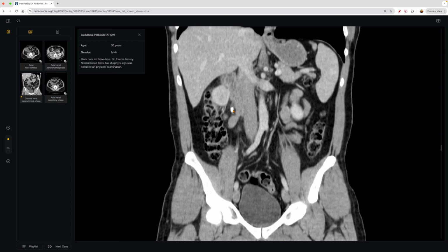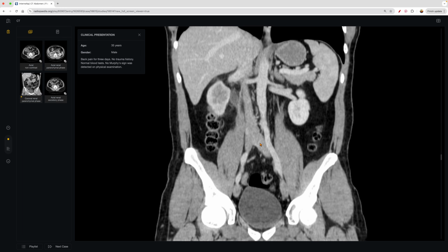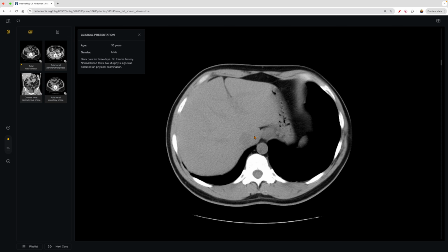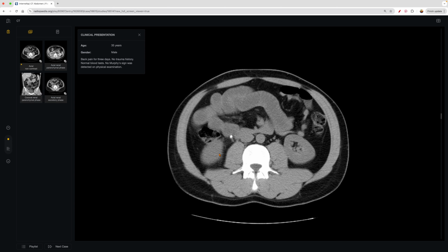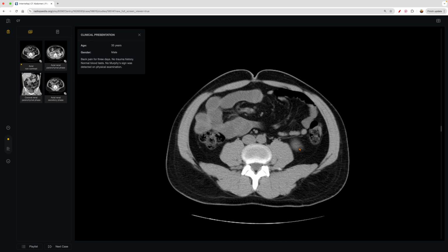This is also known as hydroureter. And then you can see the obstruction here. So it took us a little while to find, but you certainly see the calcification. Now, if you were to look at it from the non-contrast axial, which would be the ideal image, then we can scroll inferiorly, and then we can see the same idea here. The hydroureter, the dilation of the renal pelvis, and you can see the obstruction. And shortly after the obstruction, there is no dilation, right? It's everything prior to the obstruction. And again, that's another case of how a kidney stone can present.